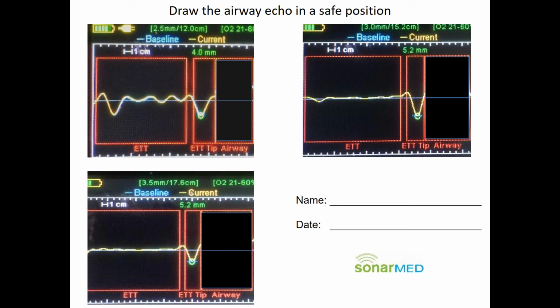Hopefully that helped clear up a few things, but know that we're still here for questions, and we will continue to go over the waveform with you in person every time that we see you. In no time, this will become easy for you to read, and you'll come to rely on these screens a lot.